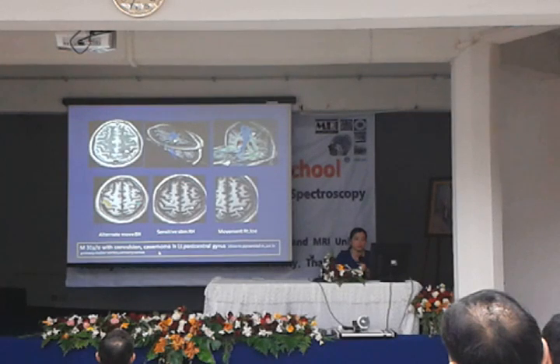Then the surgeon decided not to operate in this case and to follow up. Then the lesion got smaller and smaller, because it is very close to the very important fiber that controls our limb movement. Surgery may cause damage to this fiber, and the patient may become paralyzed.